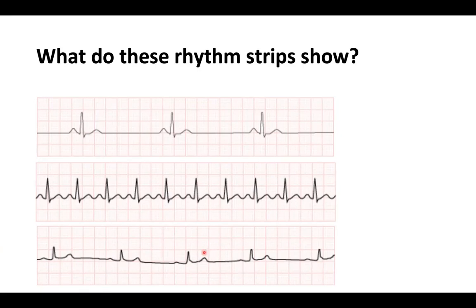So if you get this in an OSCE, it's sinus arrhythmia because there are P waves before every QRS. The P waves have the same shape. The PR intervals are constant and not prolonged, about 5 small squares. And the only thing is that the rhythm is not regular, because here the RR interval is prolonged. But there's no dropping of QRS complexes anywhere, and there's no prolongation of the QRS complexes. So this is why it's not heart block.